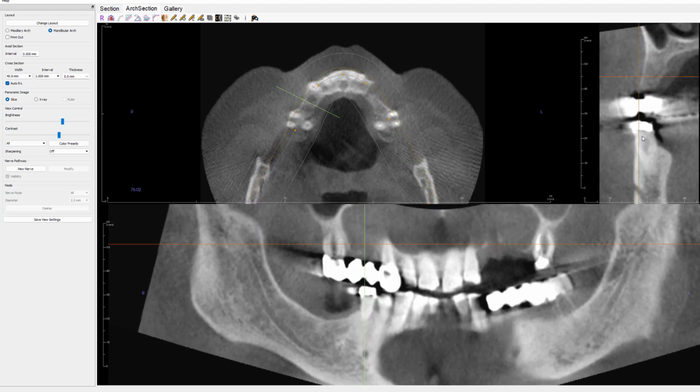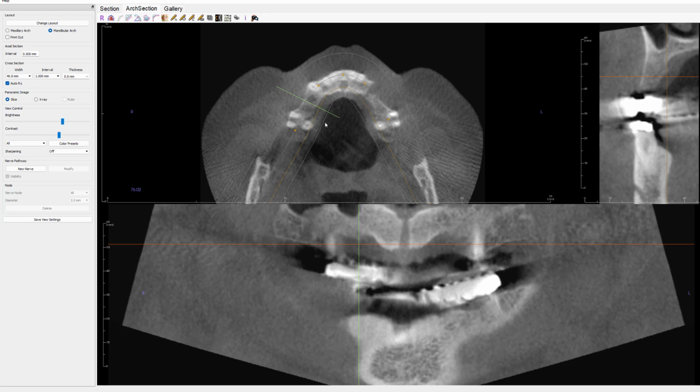And so that was just a quick rundown of how to use the software. This is called the Egg Viewer, the built-in viewing software that you can get with Invivo from Anatomage, or TxStudio, which is basically the same software, just packaged up for iCat.